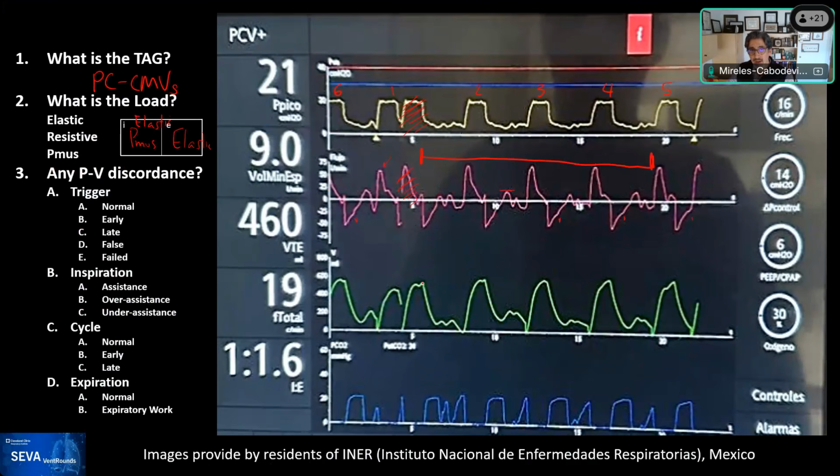And you can see how the volume has this notch here, which we recognize here. And then there's inspiratory flow right here. So this is inspiratory flow, inspiratory flow. Here it's even more marked. Inspiratory flow, inspiratory flow. So it looks like during these periods outside, there are oscillations that are causing a little bit more air to come into the patient.